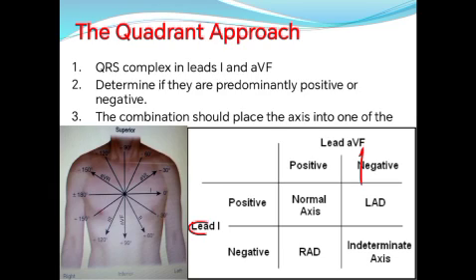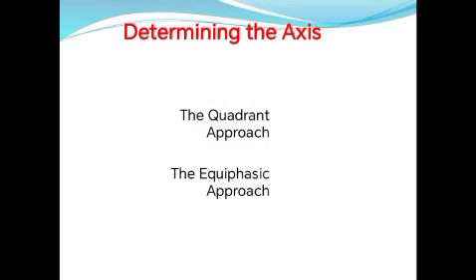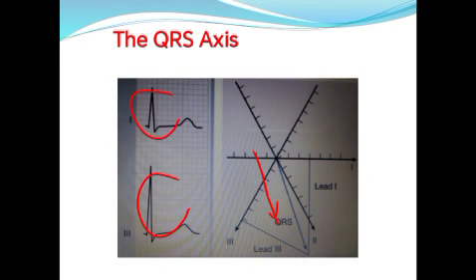Sorry, I mean if lead 1 is positive and lead AVF is positive, this is normal, as you see in the first ECG I showed you. Sorry, go back here, this one.